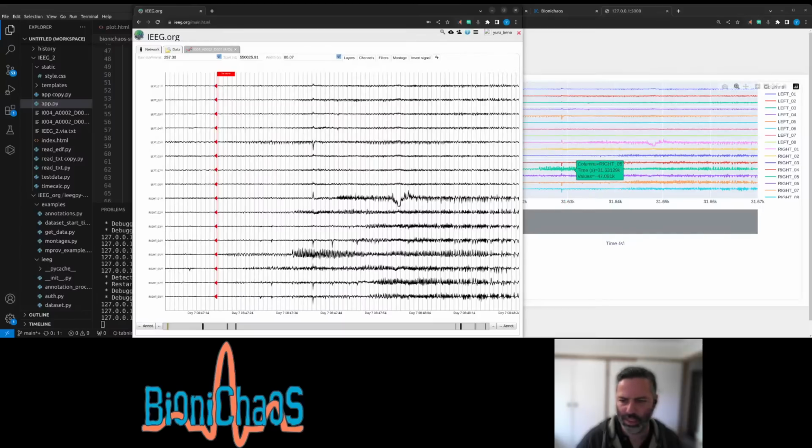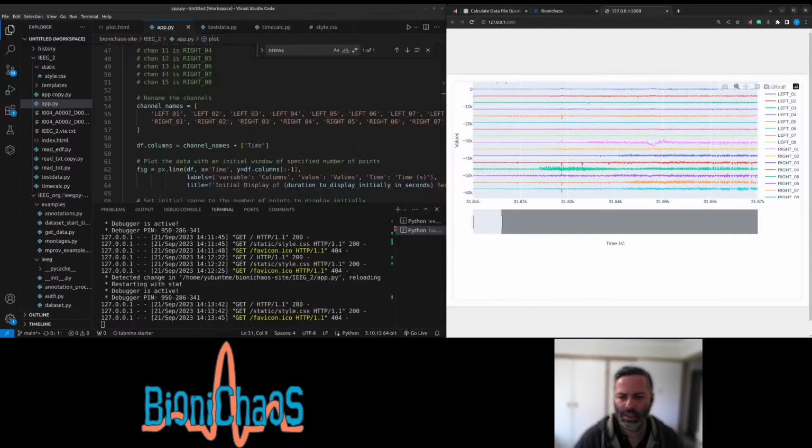And this one here, the green one, should be right of 5. That's right. And this one should be left of 5. Okay, now it's correct. We are in business.